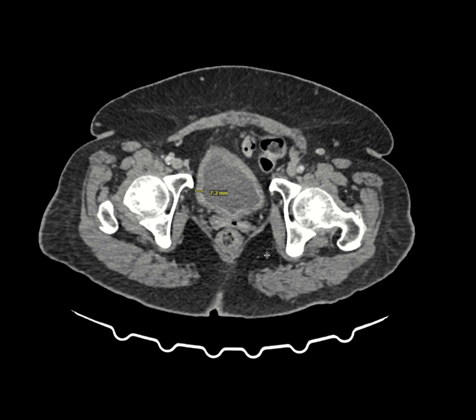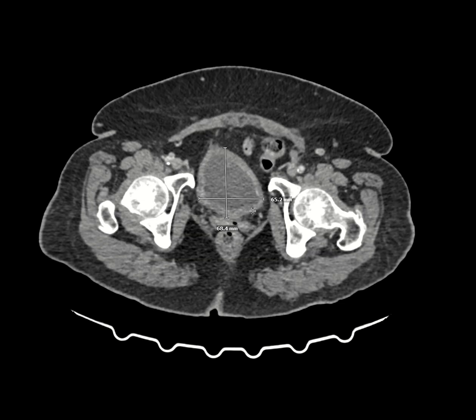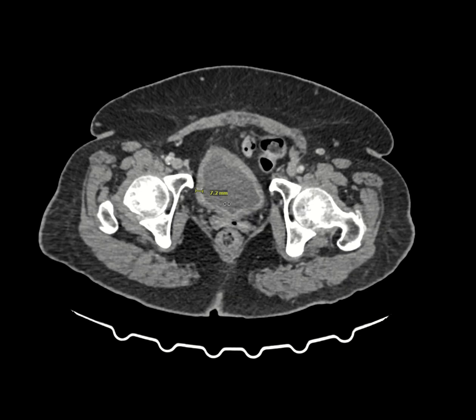thickness? And one of the things that was found out was that the more distended the bladder is, the thinner the wall ends up being. And so the more underdistended it is, the thicker the bladder will appear normally. And so there was a study that looked at bladder wall thickness and normal values relative to the actual volume.